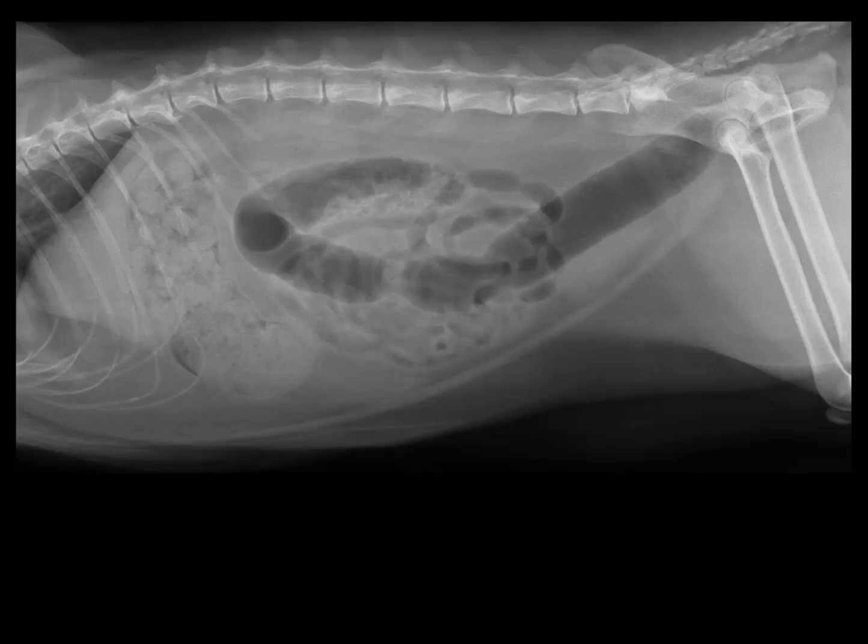Here we have a number of gassy intestinal segments and then a larger gassy intestinal segment. And this one's relatively straightforward because I can follow the big gassy segment all the way back to the rectum, so I'm very comfortable that this is large intestine, and it's nice and continuous and a reasonable size and shape for large intestine, location for large intestine, a little bit of plausible fecal material here.